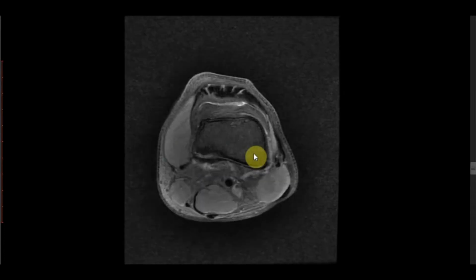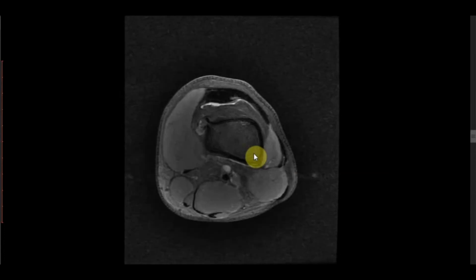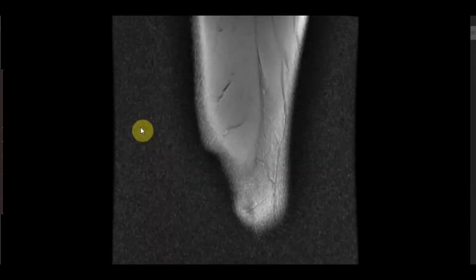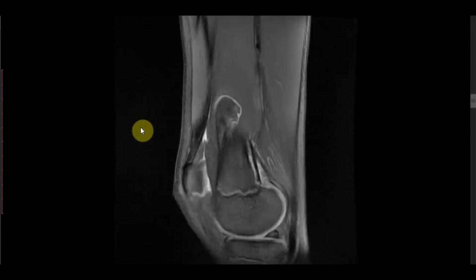head of gastrocnemius. So what is this lesion? This is cortical desmoid. Cortical desmoids are do not touch lesions. They are benign lesions, and they are because of chronic avulsive stress at the origin of medial head of gastrocnemius and insertion of adductor magnus. And we can also note this on the sagittal PD fat sat.